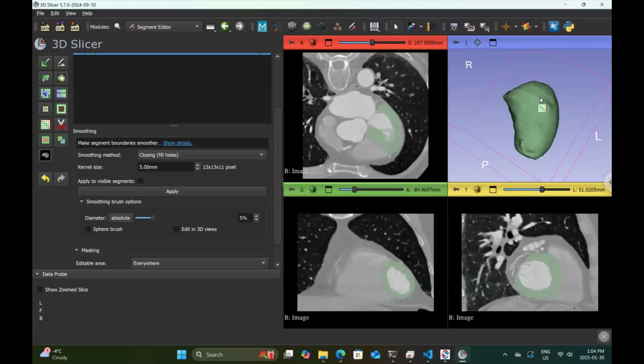No. I think we should just stick with the left ventricle because it's really hard on a coronary CT scan to see clearly the atriums and the right ventricle, because the walls are thinner and coronary CT is probably not the best way to segment these. The reason we are doing the left ventricle is that the majority of the left coronary artery feeds the left ventricle, so I think this is an important structure for further analysis.